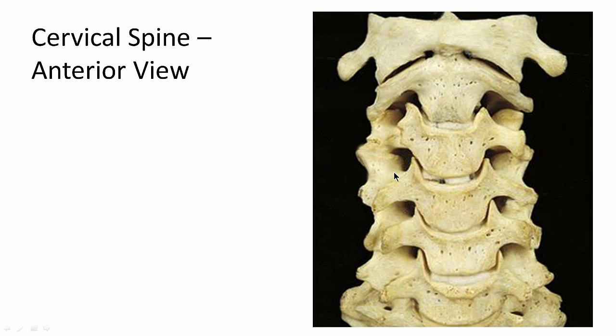Here's the trough we talked about before. Okay, look, here's a narrow trough. See that? That's the neural groove. For the most part, it's just for the ventral ramus. There's the posterior tubercle, anterior tubercle. You can count these down. That's 1, 2, 3, 4, 5. So this is body of C5, uncinate process of C5, transverse process of C5, but you got to be more specific.